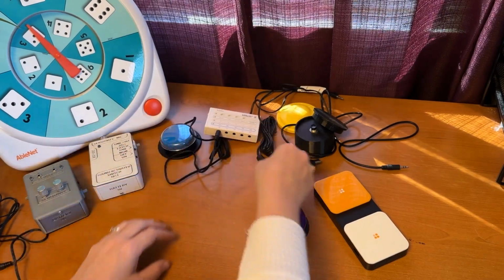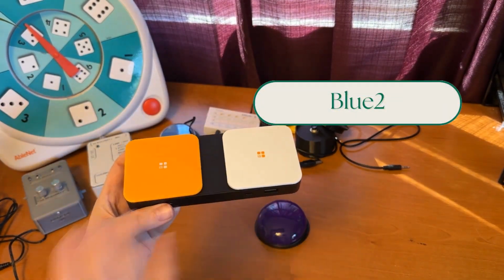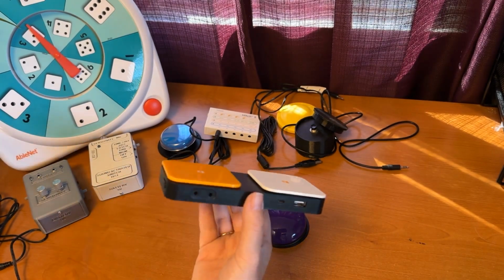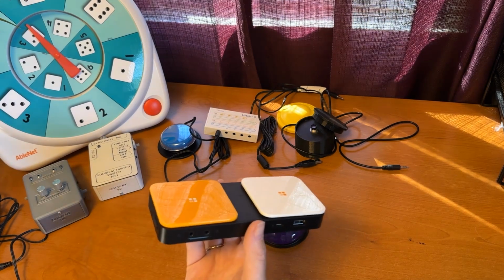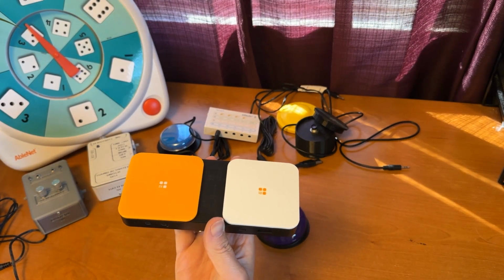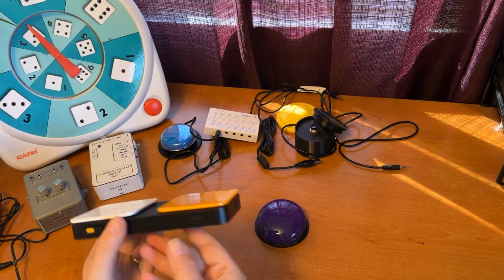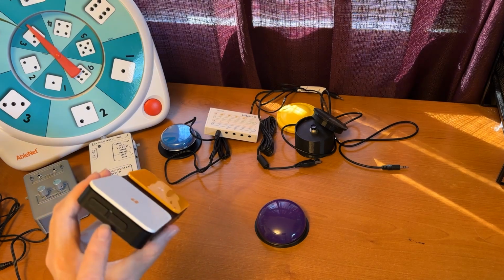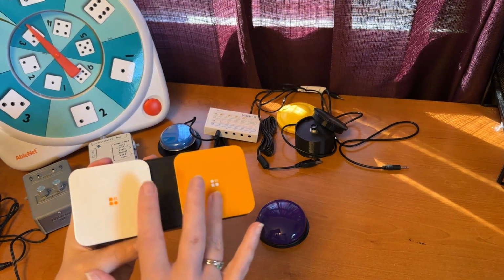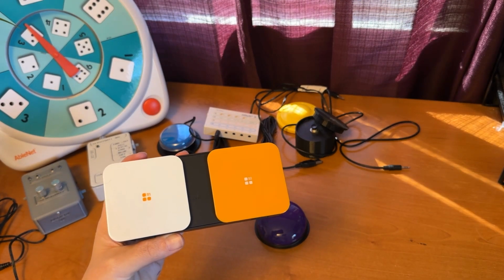The final switch that I have as an example here today is called a Bluetooth. There is a newer model of this now that looks a little bit different that just came out. Concept's the same. It's a little lighter touch. But this is actually a Bluetooth switch. So instead of plugging this into your computer or your iPad or your tablet, you are going to connect it by Bluetooth, using the pairing button over here on the side. And then these become 1 and 2 switches to control or trigger things on the iPad or computer.